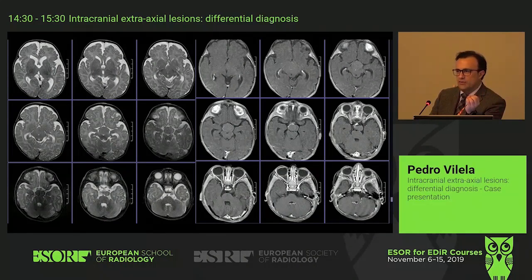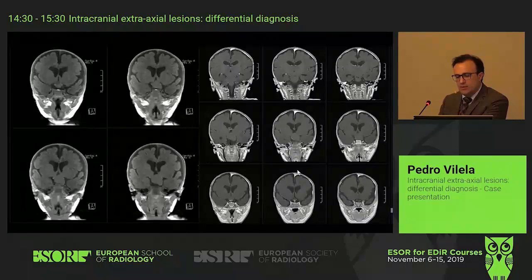Differential diagnosis, optochiasmatic astrocytoma. The optic nerves were actually normal. You see the optic nerves there? And then you see the chiasm and everything, it's actually completely normal, and there is no edema, no contrast enhancement, so no optic nerve edema, so it was hypothalamic hamartoma.